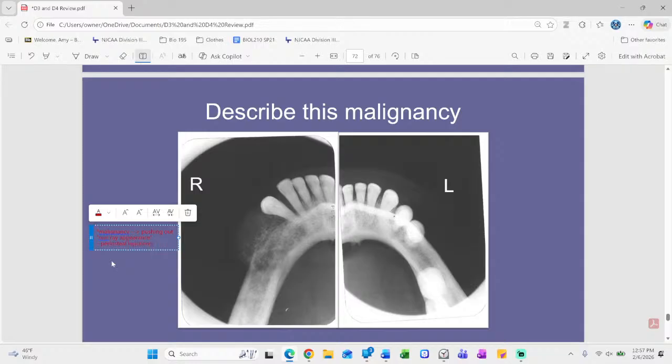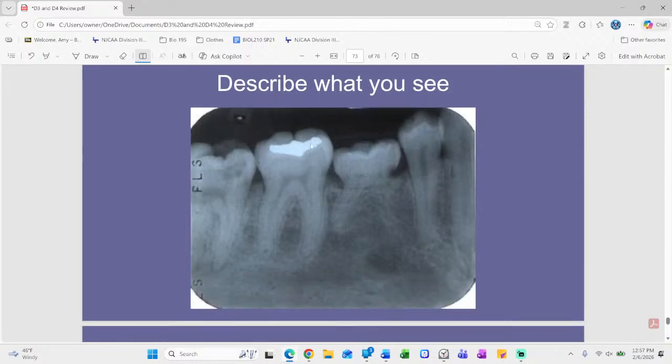True occlusal there. Describe what we see. I gave you this in year 2, and now you can tell me tooth number 27, 28, T. So what's congenitally missing? 29. And I can say that with certainty because I still have that primary molar there. Right? Mental foramen, IAN. There's my canal. He's a little wide. Yep, we got caries, so that could be true pulpal. Or again, it's because that canal is laying down on top. Adds a little lucency to the look.